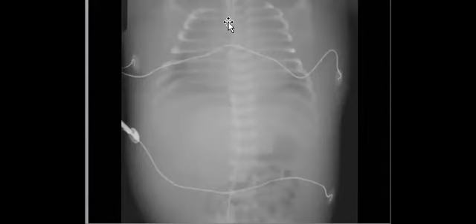Looks like there are two pathologies, one in the cardiac shadow and one in the abdominal shadow. So now what is your differential? When you see a pediatric patient, now it is an easier one. We mentioned this in the previous session. When you find the cardiomegaly and you find tumefaction or soft tissue mass in the abdomen, making displacement of the bowel loops, you are talking about a differential, and this differential should include hemangioendothelioma.